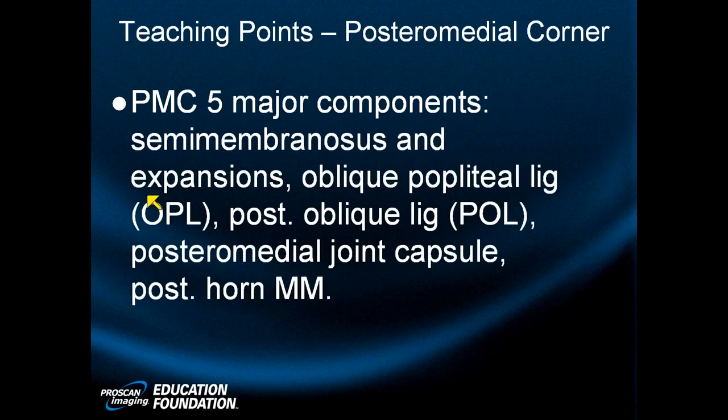There are 5 major components of the PMC. We've got the semimembranosus and its expansions, the oblique popliteal ligament component, so the semimembranosus would be the main tendon. You've seen the oblique popliteal component, which is the posterior capsule.